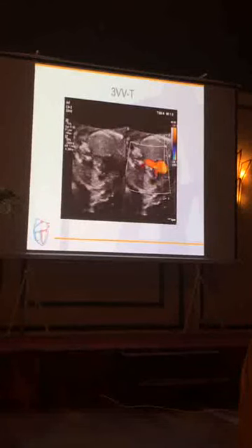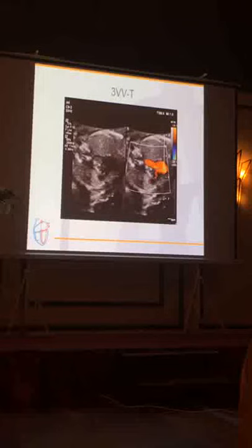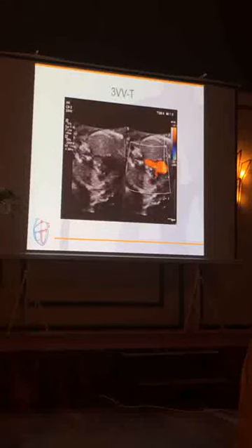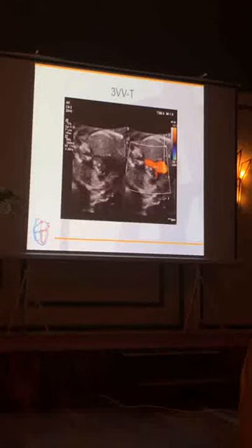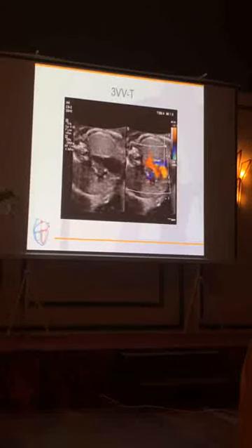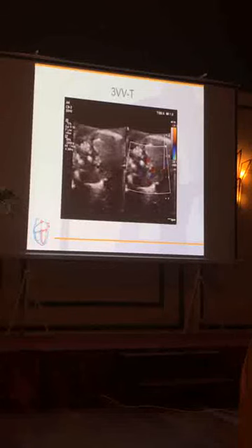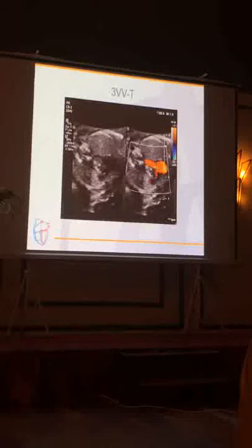By the way, there is another thing here. The vessel. Aberrant right subclavian artery. And this shows you also what obstetricians learned, I think quite recently. They learned that they have to use color Doppler in mediastinal scans, because there were some papers suggesting that aberrant right subclavian artery is a marker of Down syndrome, which is really not that true, but they started to use color Doppler on mediastinal scans, and it really helps a lot.